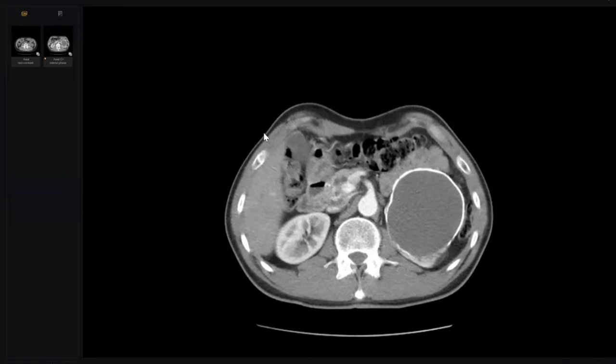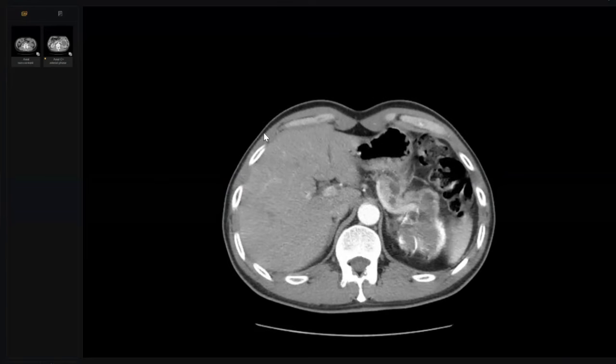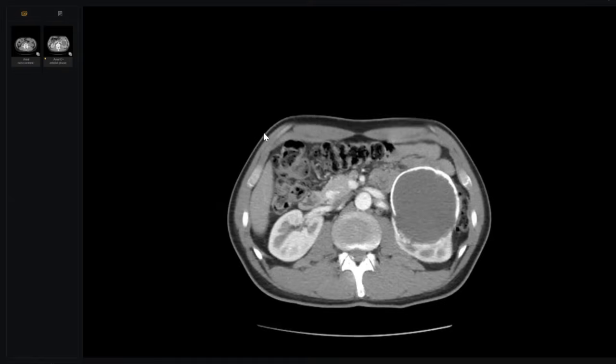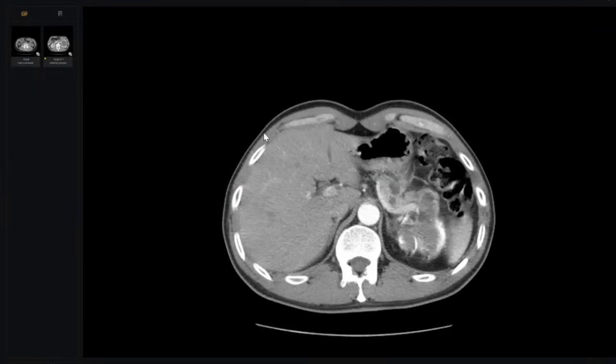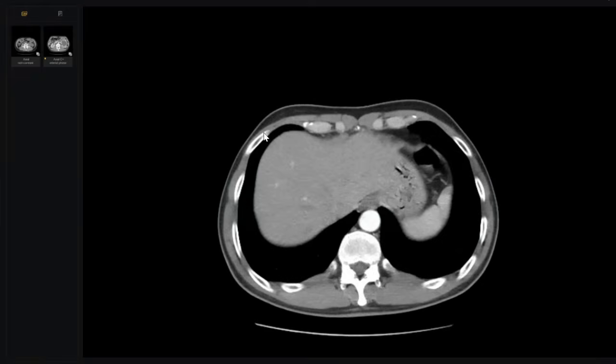Sir, I think that this cystic lesion has continuity with the tail of the pancreas. So in my routine practice, it could be a cyst, however I would like to see the MPR images if available to know whether it is arising from the kidney or from the pancreas. However, it is making a claw sign with the kidney. Most likely, this is a renal cystic lesion. However, I would like to see the MPR images if available for this patient.